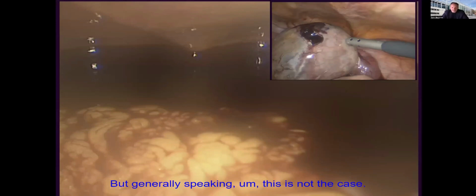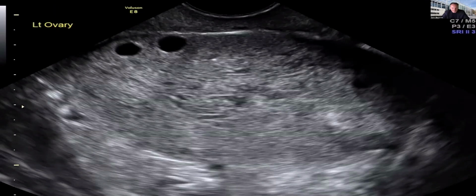But generally speaking, this is not the case. Another example of a mass or condition that you should be aware of, which can cause pain. Here we have ovarian torsion: typical peripheral follicles, somewhat blurring of normal ovarian architecture, ovarian edema, and this is a classic picture of ovarian torsion.